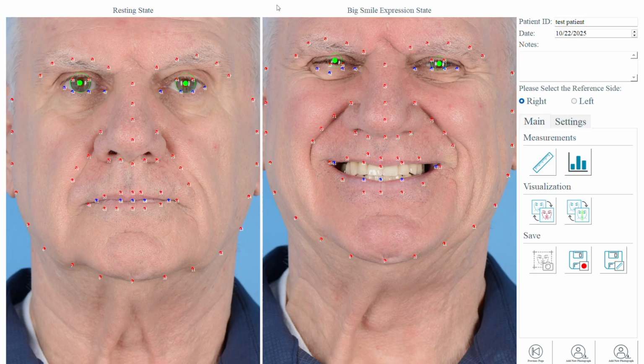A total of 76 landmarks are placed on the face in Emotrics. These are logical landmarks placed along the free margins of anatomical features and can be adjusted to accommodate each patient's facial structure. The blue dots correspond to free margins of the lower eyelids and the upper border of the lower lip. The red dots correspond to free margins of the upper eyelids, the superior margins of the eyebrows, the nasal base, the nasal midline, the nasolabial folds, the vermilion borders, and the overall facial outline.